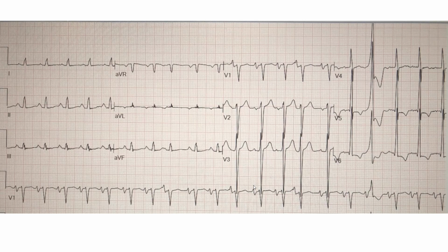Now, I see something else on that EKG. He has biatrial enlargement. Look at the P wave in lead V1, big positivity up, big negativity down, big right atrium, big left atrium. Here in lead 2, high P, big right atrium, wide P, big left atrium. That also supports that diagnosis of biventricular failure with probably 4-chamber enlargement.